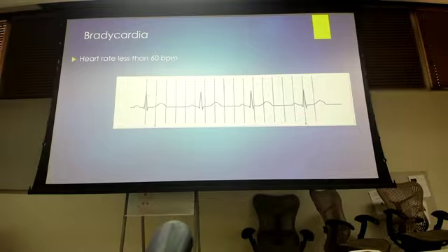Right here, man. Okay, sir. I want you to tell me what the rate is using the counting method. Say 300 divided by 5, that'd be like 60. So 300, 150, 100, 75, 60, 50-ish, right? So between 50 and 60, maybe 54, 55, something like that.